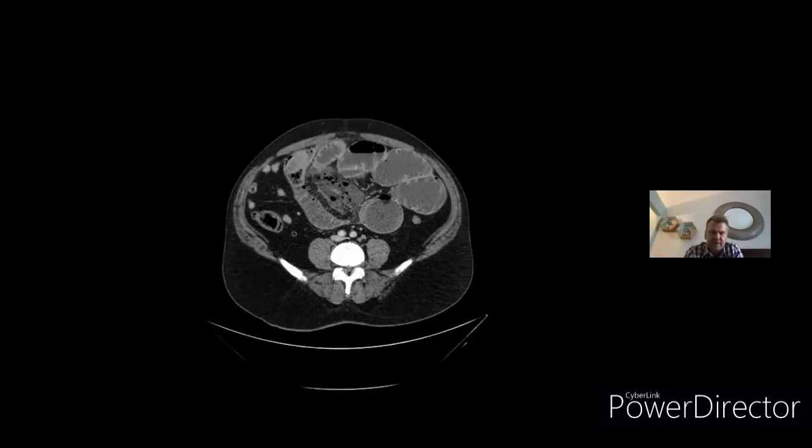And on this slide, in the center of the abdomen, you can appreciate that there's some small intestine which isn't enhancing as well as the surrounding bowel. It's ischemic and necrotic intestine, again with air in the wall and probably also some extraluminal air. And then immediately above that, on everyone's top left in the peritoneal cavity, in the lumen of that bowel, you can see a gallstone, which is enhancing the same as the wall of the small intestine.